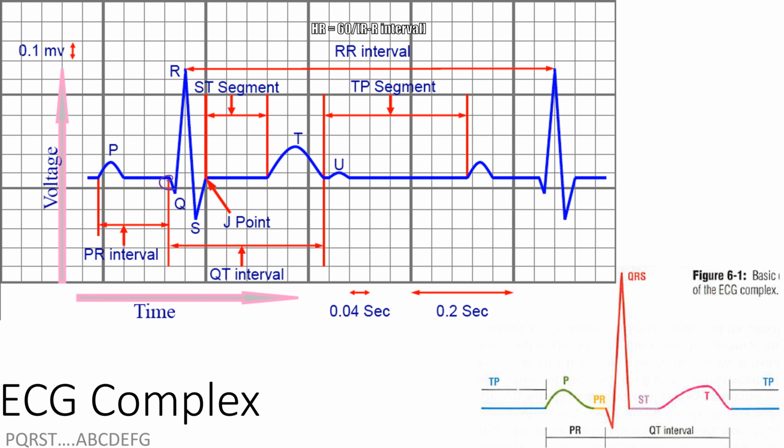They're from isoelectric, not the Q, but right before the Q, to the isoelectric over here. QT interval is right there, right? QT can be funky because people won't put it before the T wave, it's just after. I don't have a good mnemonic for that, but we only know once the ventricles have officially completed, and that's when the T wave is officially finished, right?